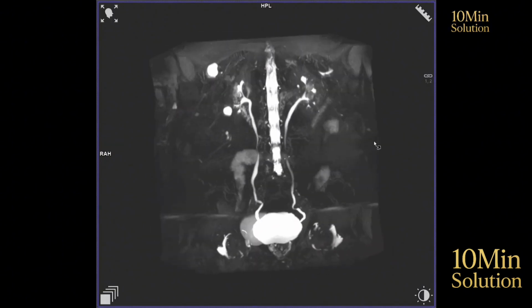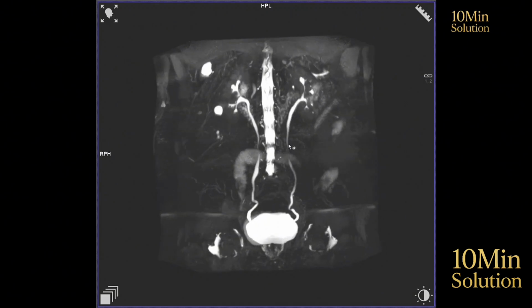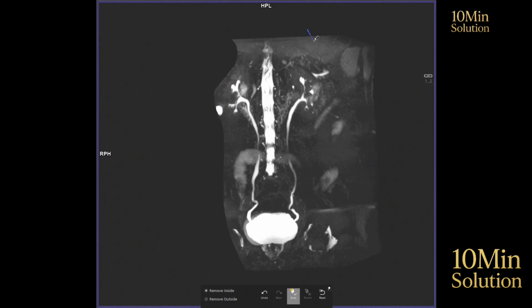Now what we need to do is keep the kidney, ureter, and bladder according to this anatomical position and remove everything else that remains. And to cut this, what we need to do is come here and look at the options. Now we will carefully observe and then cut everything away, as you can see.